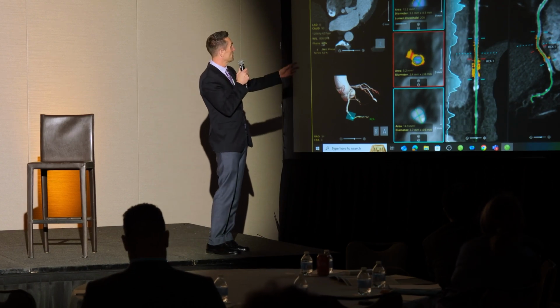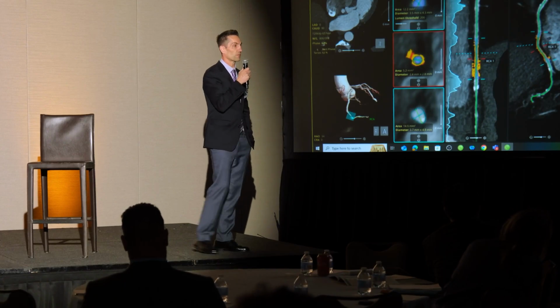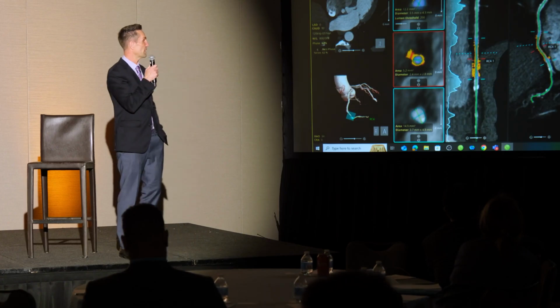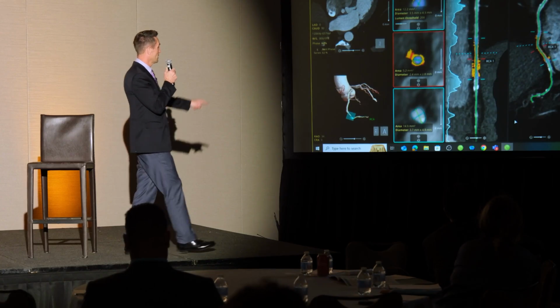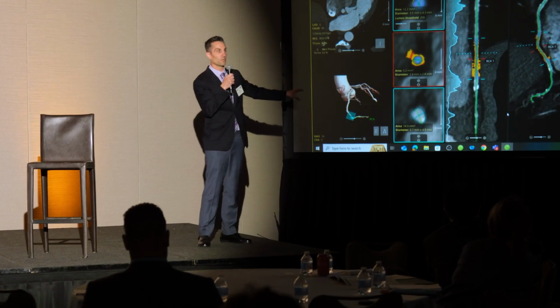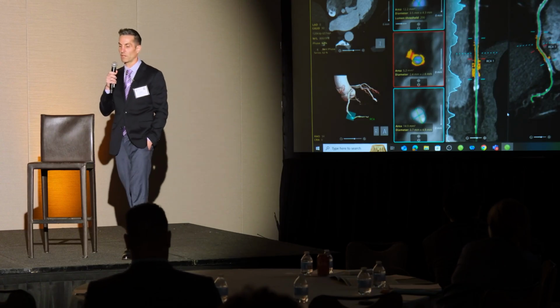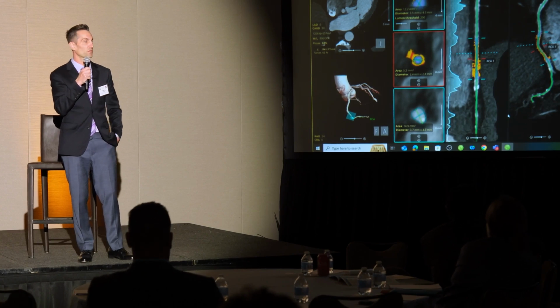And then we can see they're able to go down and start picking up some of that pericoronary fat attenuation or inflammation around the vessel. And what's nice here is you get all the things that you would normally need from a 3D lab, for one, evaluation of the cardiac exam, but also for reimbursement.